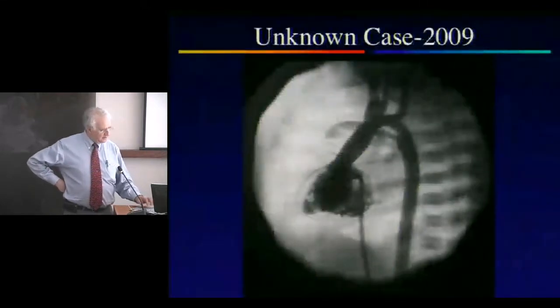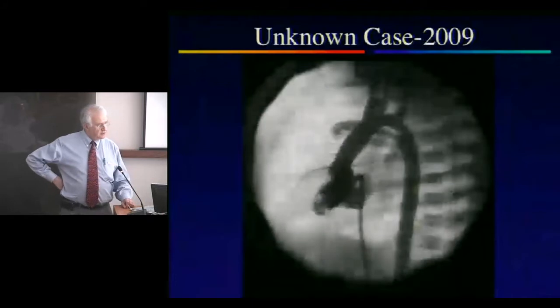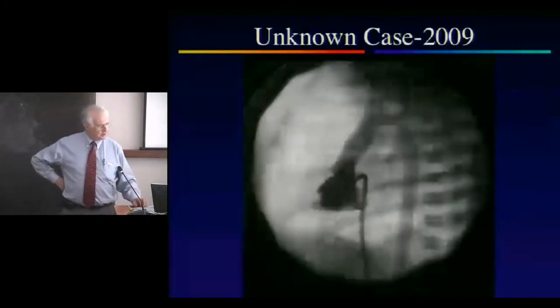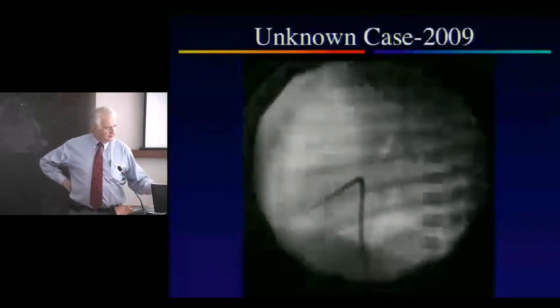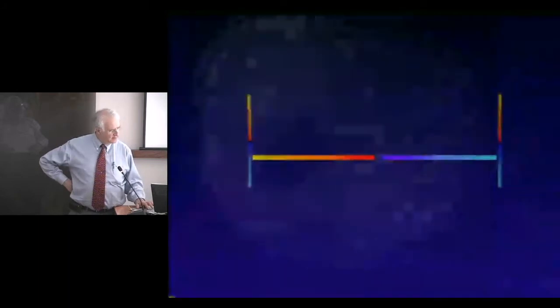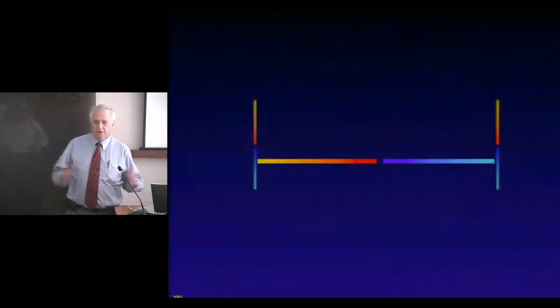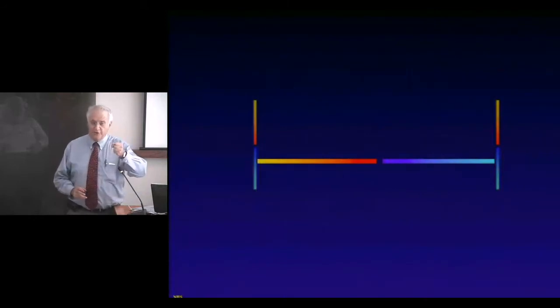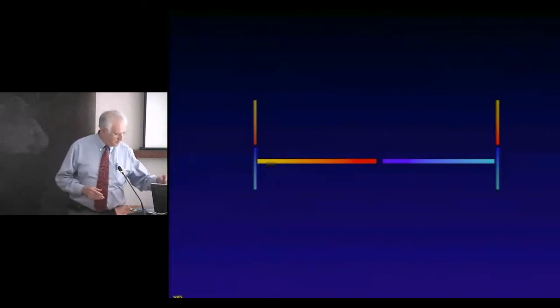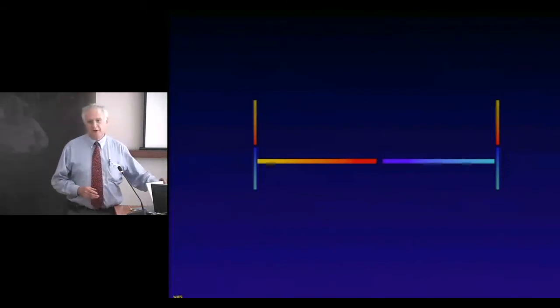And then looking at the lateral picture, there you can see from the aorta that the main pulmonary artery is filling, and both branches are seen now because there's actually a little ductus here. Okay? And so this was two ducts, and one constricted off that wasn't connected to the pulmonary artery or to the arteries. And all that happened was the patient went to surgery and had the artery anastomosed and is doing well. So congenital absence of the pulmonary artery.